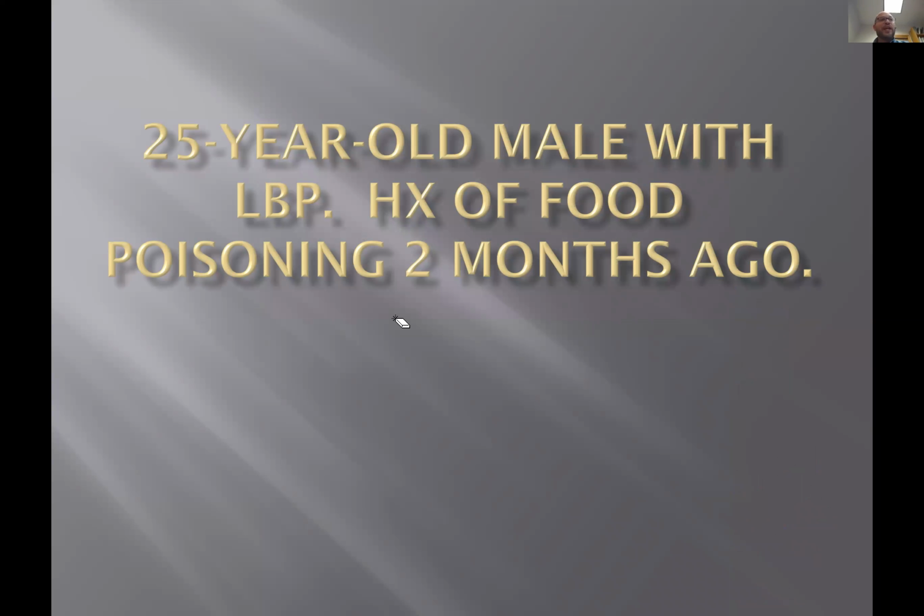A typical os odontoideum is a residual of a type 2 dens fracture. This is a weird one. This is like a real developmental one. An ununited secondary growth center, as the doc said. Exactly right. But typically, they're higher up lucency, and it's an old type 2 dens fracture.